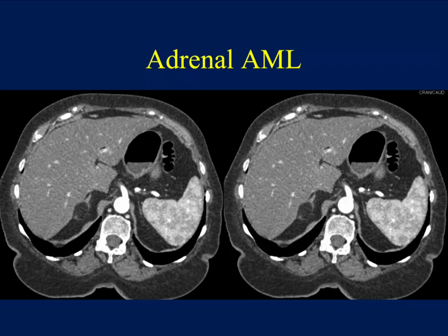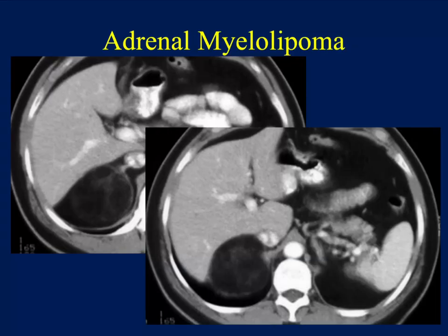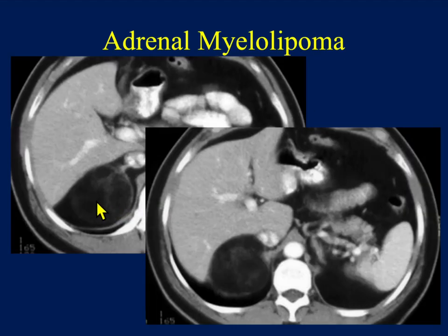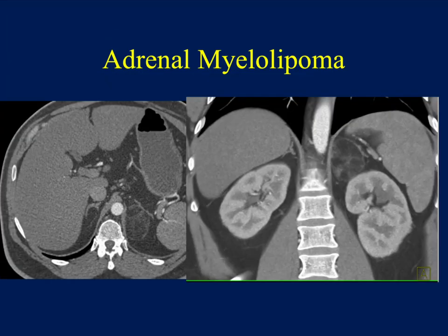So some examples: a small 2-centimeter myelolipoma, right adrenal gland, 100% fat, no difficulty making the diagnosis. A 5-centimeter one. In this case, you see a little bit of swirling. Whenever you see swirling in a patient with a myelolipoma, it usually means it bled at some point. So a case like this, it's in the 5 cm range, it bled previously, this patient is likely going to get surgery if they have any symptoms at all. Even if they had no symptoms, it would be considered as well.